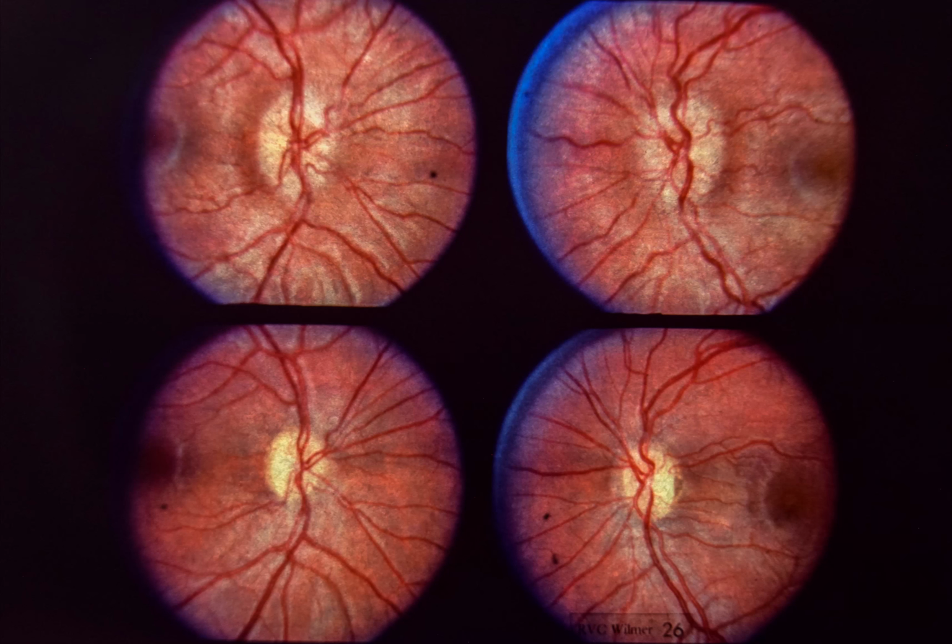Upper left and upper right. Both optic discs are edematous with generalized blurring of the peripapillary retinal nerve fiber layer. 1 week later, visual acuity had decreased to hand motions right eye and 20/400 left eye. The patient was started on systemic steroids, and within 1 week, visual acuity had returned to 20/20 with normal color vision and full visual fields in both eyes.